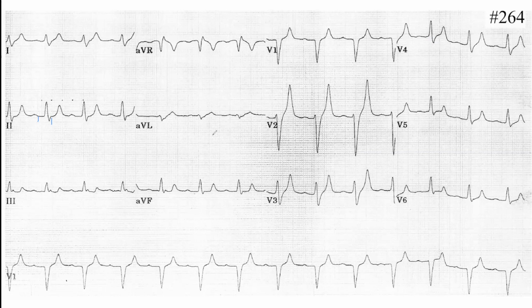First thing, if you want it by order, we can do it, but I think it's hyperkalemia. Again, the last time you didn't like teasing anybody. So in an ECG, you have to have some teasing. So when you see the diagnosis, you are right, but nobody will understand why.